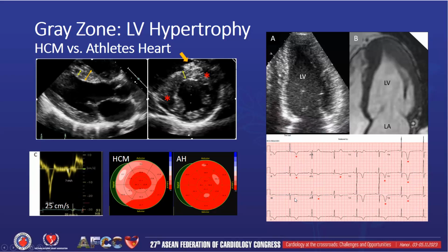I actually believe the EKG is a more sensitive test for apical hypertrophic cardiomyopathy than echocardiography, because these deep T wave inversions are classic and almost pathognomonic for this condition, where you have the deep T wave inversions that progress out here into the lateral precordial leads, sometimes also referred to as the apical leads. So if I see this EKG and I see that they have a normal echo, I won't believe the echo, and I'll go back and look at this again. Sometimes these abnormalities are due to apically displaced papillary muscle without hypertrophy in that area, but that's important to know about as well.